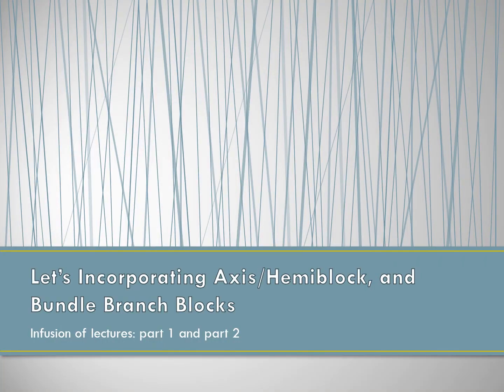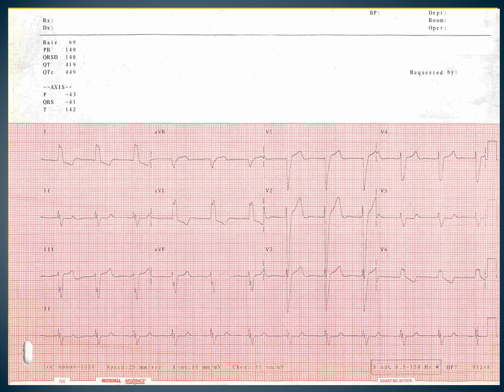All right, since your confidence is up, let's incorporate axis and hemiblocks from Lesson 1 into our interpretation of bundle branch blocks. So get out your Bob Page axis and hemiblock chart and let's get started. Here's the first printout. Start at the beginning with the axis deviation. Compare leads 1, 2, and 3 here to your Bob Page chart.